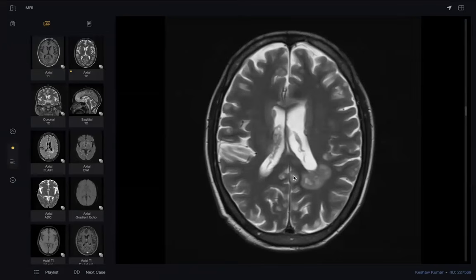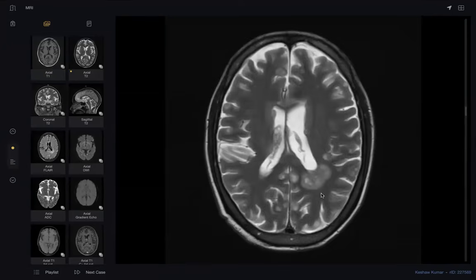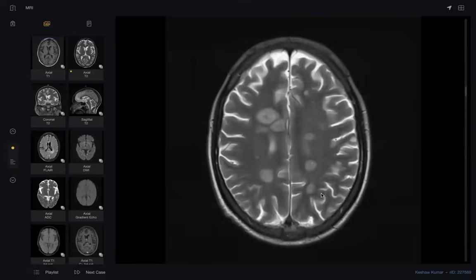Tuberculoma must be more darker. But if you concentrate here, it is almost fluid. Abscess is okay, hard. Almost generally fluid. With tuberculoma, look at this dark point. Tuberculoma, all the center is dark.